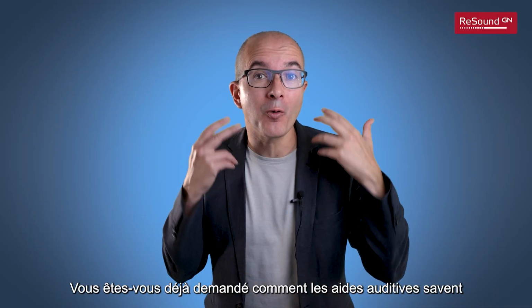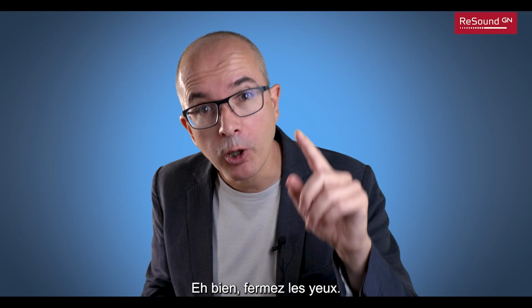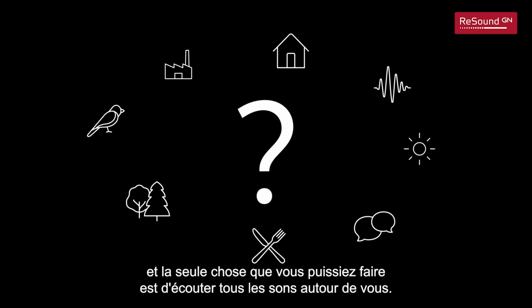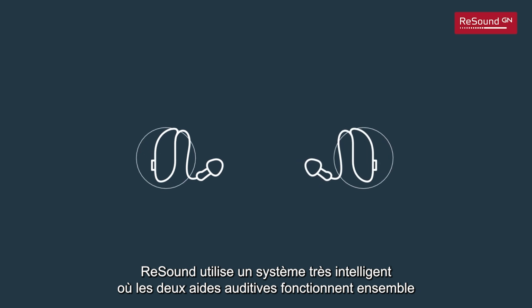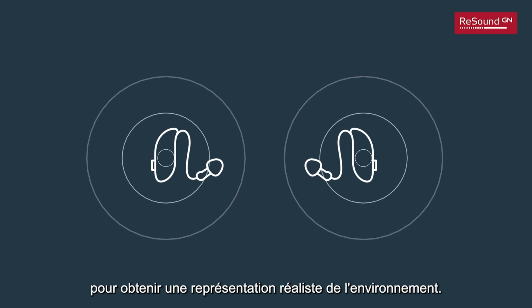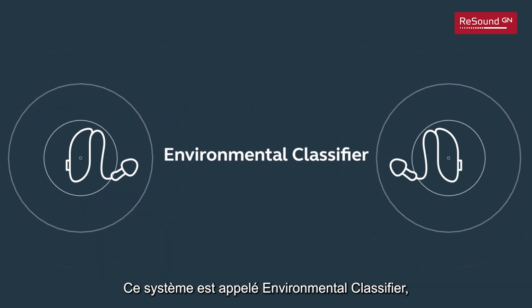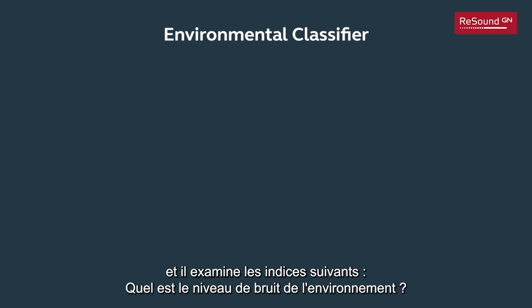Have you ever wondered how hearing aids know in which type of environment they are in? Well, close your eyes. Now you are a hearing aid trying to figure out where the heck you are, and the only thing you can do is to listen to every sound around you. ReSound uses a very intelligent system where both hearing aids work together to get a realistic representation of the environment. This system is called Environmental Classifier, and it looks at the following clues.